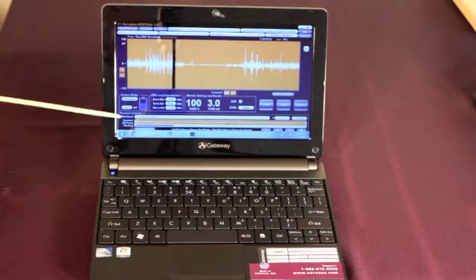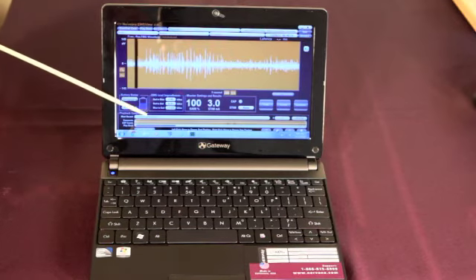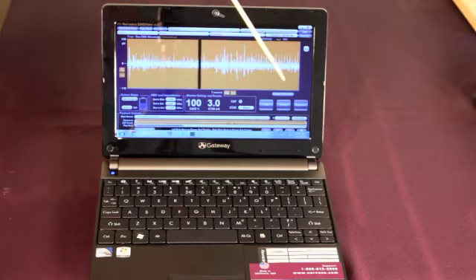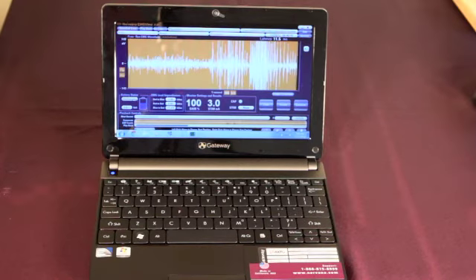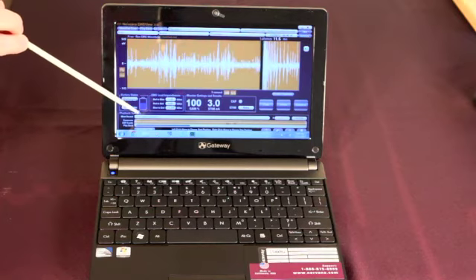Next, I'm going to move to the very top bar. And there where it says Most Recent, you'll see some text appearing in the white bar. That text indicates whether the test button on the Nirvana was depressed or if a comment had been entered during the recording. What I mean by that is if the user had pressed the comment button while recording and typed a comment into EMG View, that comment was saved. And at the point in the playback file when that comment is added in time, it will appear here in the most recent comment bar.